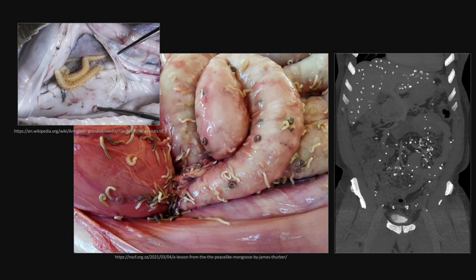The diagnosis in this case is called pentastomiasis, which is caused by Armillifer armillatus. Armillifer lives in the trachea and bronchi of infected snakes. After ingesting contaminated bushmeat, Armillifer eggs hatch in the intestines, and the larvae cross the intestinal wall and migrate into various tissues. As these larvae die, they cause an inflammatory response, forming the characteristic curvilinear or horseshoe or comma-shaped calcifications. Many cases are asymptomatic, however, the inflammatory response can progress to hepatic fibrosis.